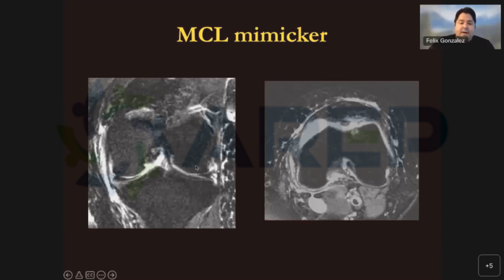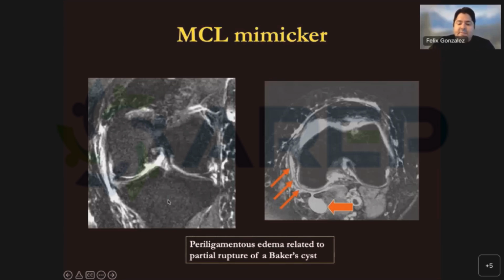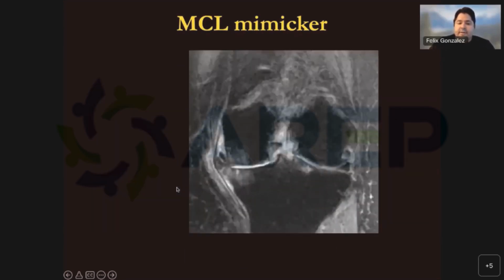Here we have extensive edema on the medial compartment. Here's the MCL. And you can see edema superficial and deep. This is another MCL mimicker.